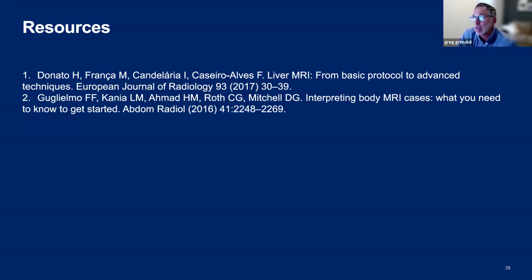MR is really good. We look at that radial MRCP and we see where the level of biliary obstruction is. Do we think it's hilar? Do we think there's obstruction that's going into first or second order radicals? So we use the MRCP to try to define the level of the tumor. We use diffusion weighted imaging to look outside of the hilum, within the liver parenchyma, to see if there's any metastatic disease within the liver parenchyma itself.